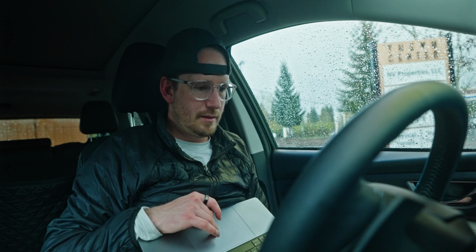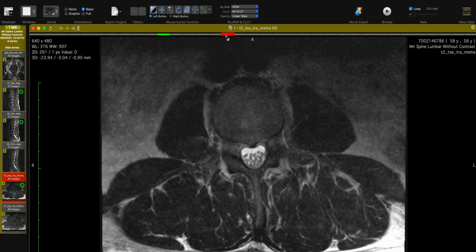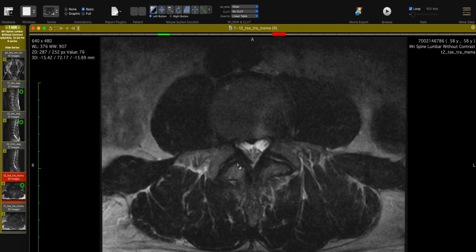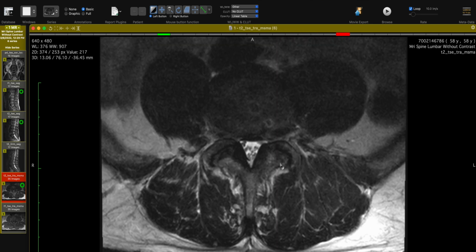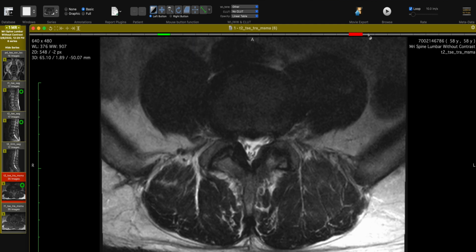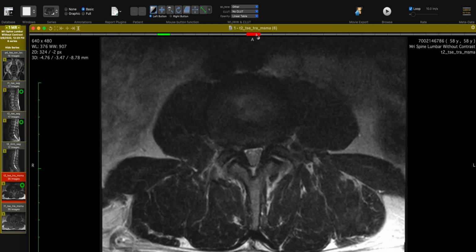So hopefully you learned something from the transverse cross section. Most interesting facts: he's twisted. And there is some narrowing through all three areas: ligamentum flavum, facet, disc. Just creating that nice little heart. Just really impinging on how much space there is for the spinal cord to move. Looks scary, sounds scary. I promise you it's not as scary as it seems. Your body's extremely resilient. So again, a little bit of facet arthritis, foraminal narrowing, central canal narrowing, ligament thickening.